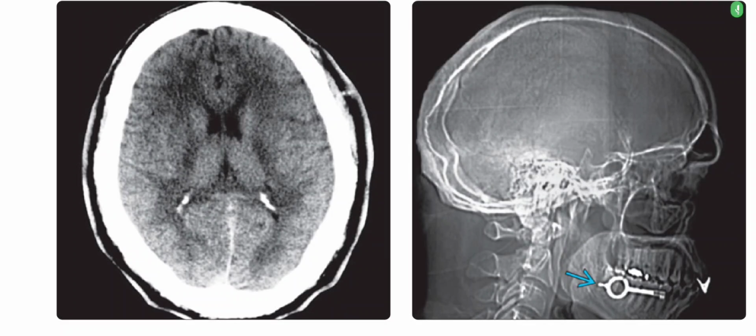So now we will discuss the imaging findings in trauma cases. So the left is the axial non-enhanced CT scan of a prisoner, which was imaged for head trauma, and it shows no gross abnormality. The right is the scout view in the same patient, and it shows a foreign object, that is the handcuff key in the prisoner's mouth. So he faked the injury and was planning to escape, but the radiologist alerted the guards and thwarted the plan.